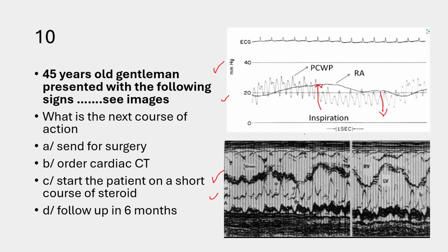That's exactly the opposite of the physiological happening. In normal physiology, usually during inspiration, the right side sucks more blood, so the venous pressure drops during inspiration. But here we are seeing that during inspiration, the pressure increases. You see it here? Yeah, the pressure increases during inspiration.